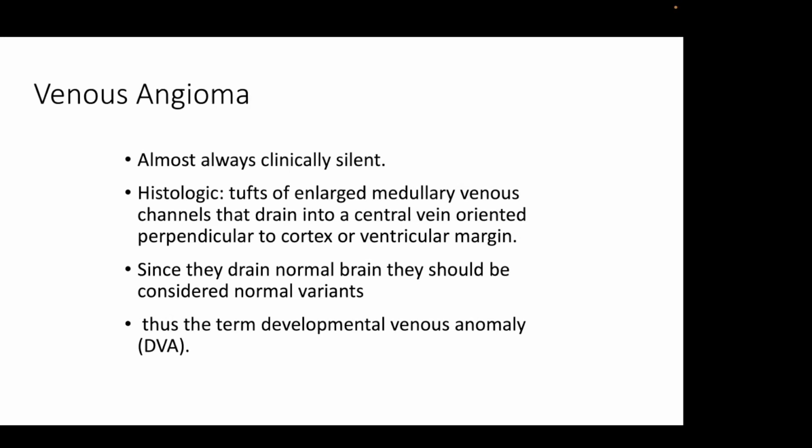Now we'll move to what I think is probably the most common abnormality I see in my own practice, the venous angioma or developmental venous anomaly. These are almost always clinically silent. The reason I say almost always is because I've shown you cases of thrombosed developmental venous anomalies. But I would say in 99% of cases, the venous angioma is not clinically evident.